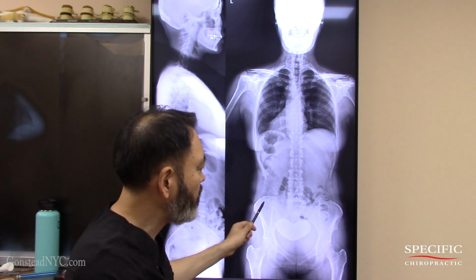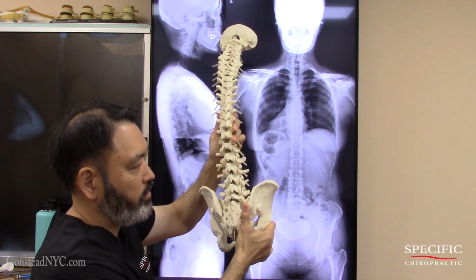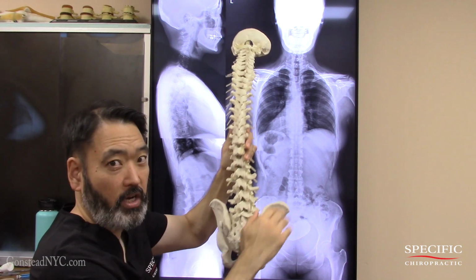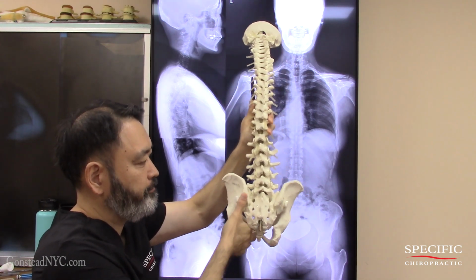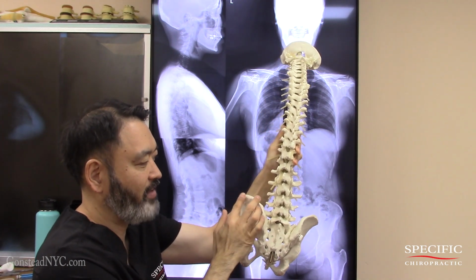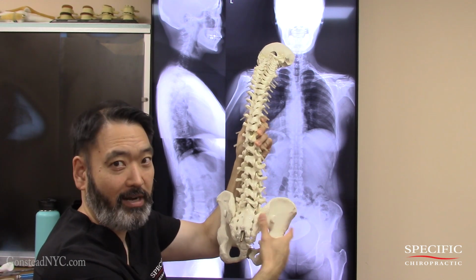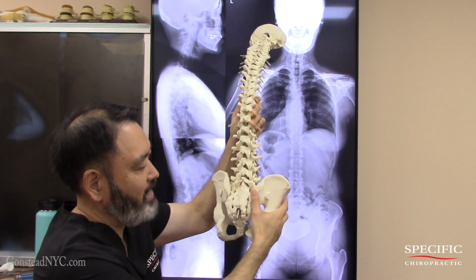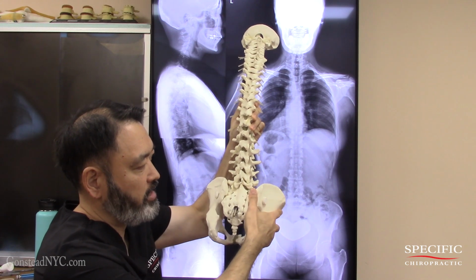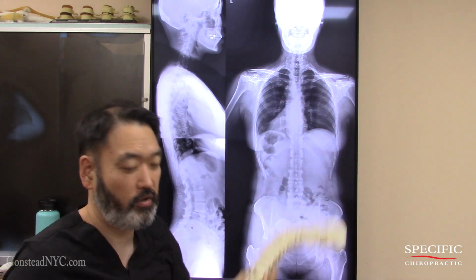The reason is that as you start to tilt over here, you start to flatten out. But if this starts to rotate this way, going more PI, then we start to have that little peak shape. So when this AS tilts this way, you see it start to flatten out. That's what we want to see.